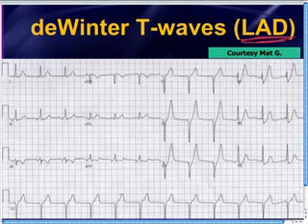Now, what's a bit unusual here is that when it was first described in a letter to the editor of the New England Journal a few years ago, it was described as, number one, highly predictive of acute LAD occlusion, not chronic, but acute LAD occlusion. And it was originally described as a somewhat static or unchanging abnormality. Well, we've come to discover through some of our own cases and through this case that if you repeat the 12-lead, you sometimes will see this evolve into a full-blown STEMI.